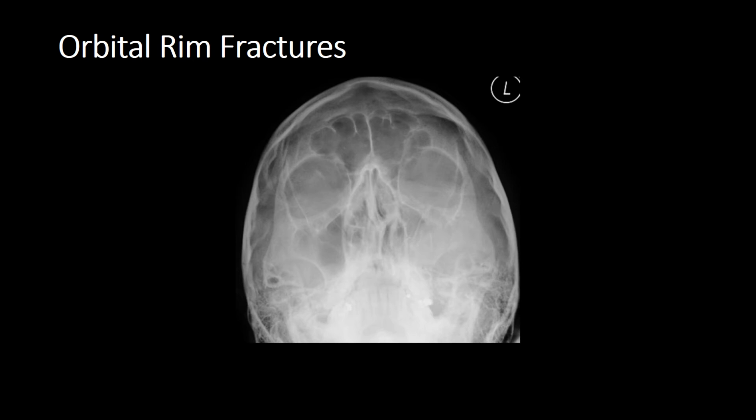Okay, just quickly check your mandible. Anything else that's going along? Okay, all good. So we've assessed for alignment. We've assessed the bones. We've assessed the cartilage, i.e. the frontozygomatic suture.